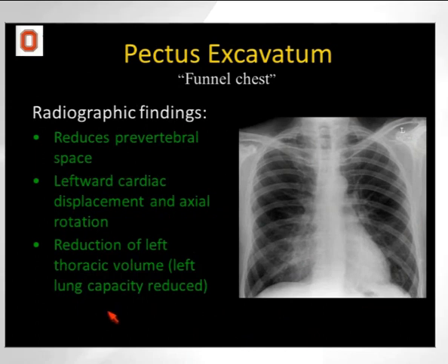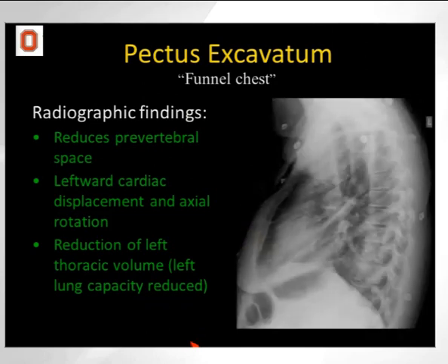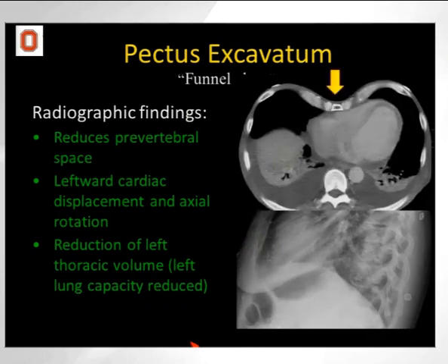We all know what the radiographic manifestations are. They're quite characteristic. Usually best seen on the lateral view. The prevertebral space is reduced. You have this very characteristic concavity. It can be low or it can be high. But the axial images really tell the story of the abnormality.